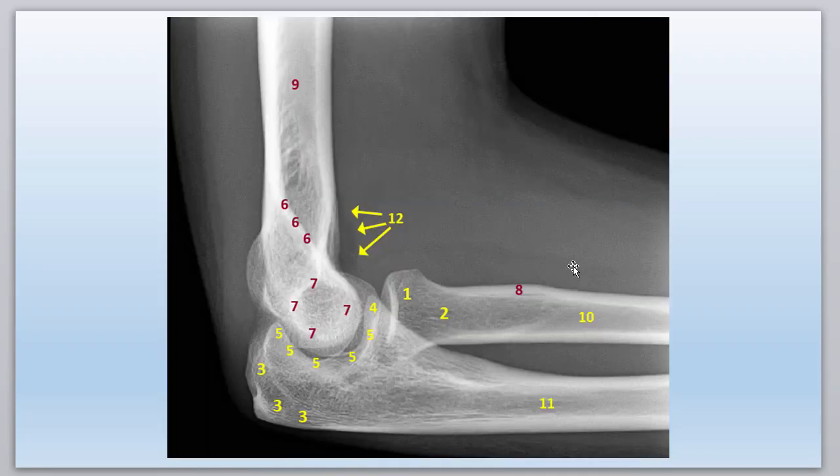All right, let's take a look. Did I not give you the answer to these? No. Well, for these, you're going to have to be on your toes, so let's go through them. Radial head here, radial neck, or neck of the radius. So that's the tuberosity, radial tuberosity, shaft of the radius, shaft of the ulna.